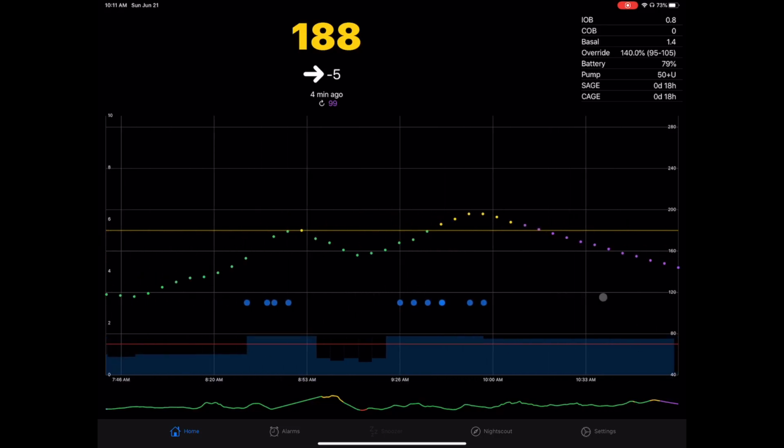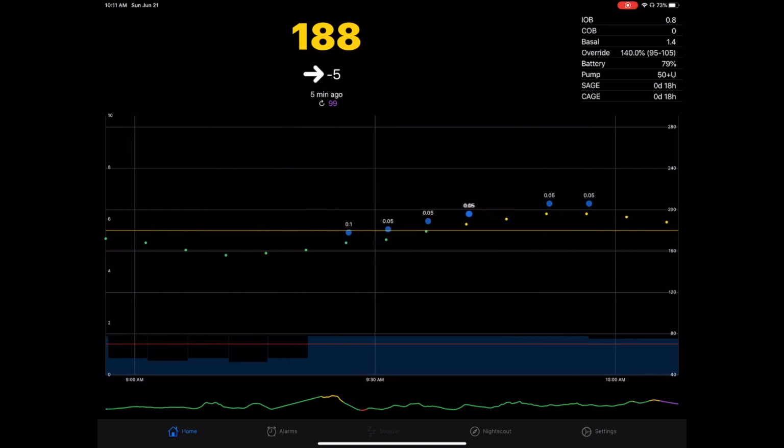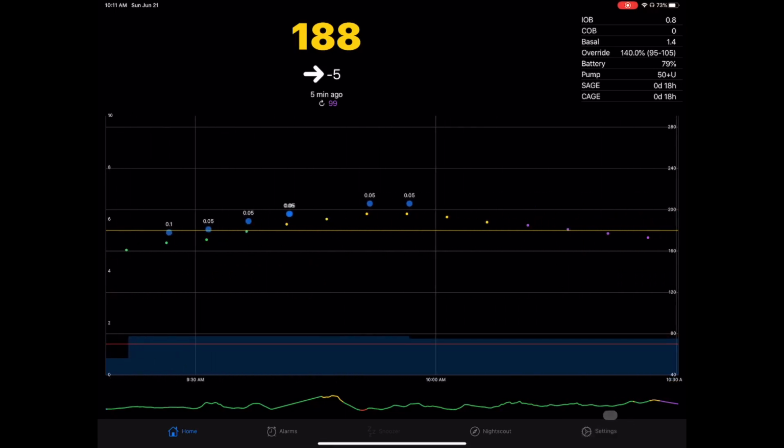Now I'm going to talk about the settings first. And if you see a slight stutter in the video, it's because I'm going to scroll down past my Nightscout URL and cut that out of the video. There you can see with the refresh, the insulin and the carbs both jumped right up onto the BG line for easier reading.